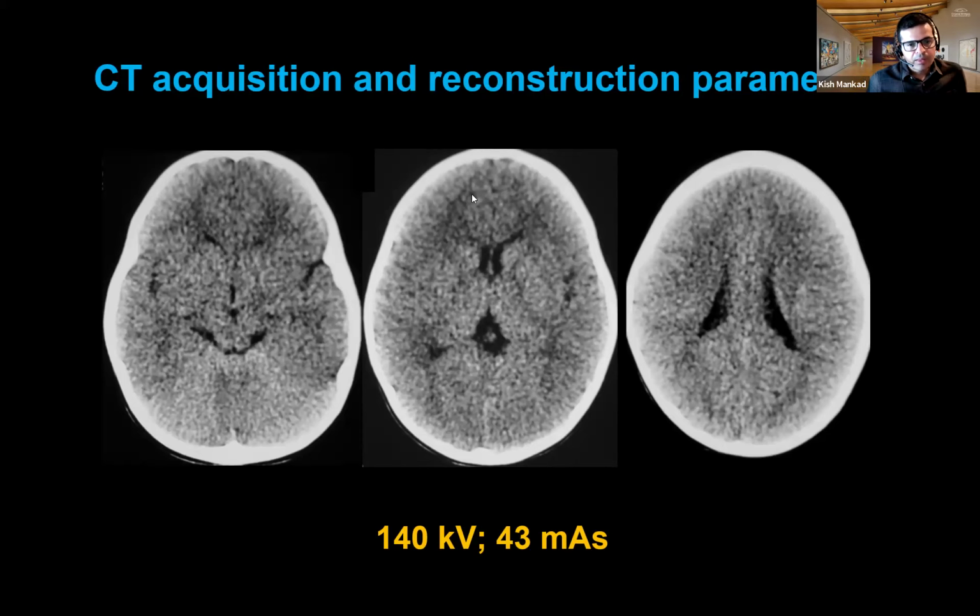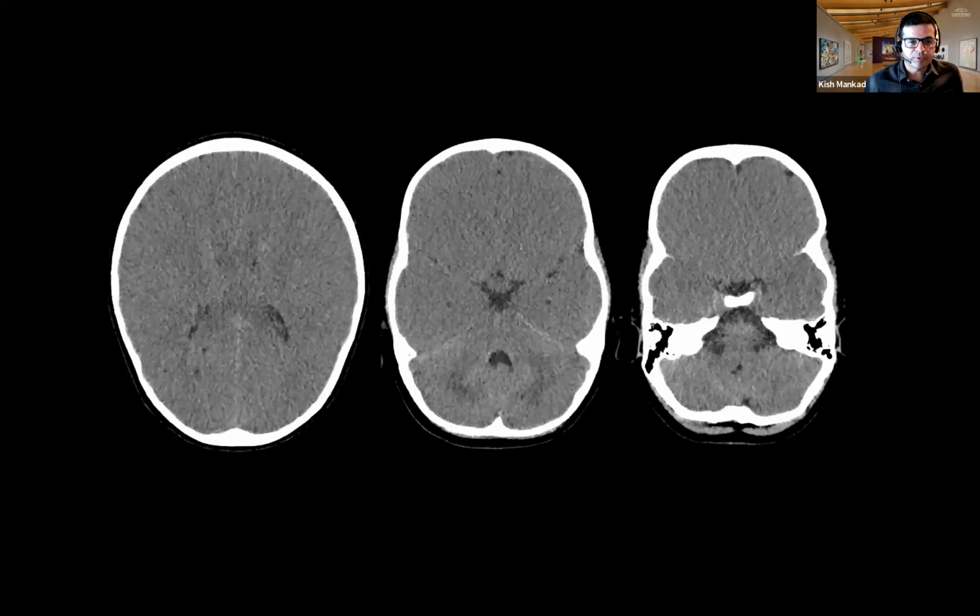So here, the problem is not what the pathology is. This is a sub-diagnostic scan. It's a waste of time, effort, radiation, energy, everything, because this is some center trying to do a very low dose CT, and that is not useful. So a test is useful when it is really useful.